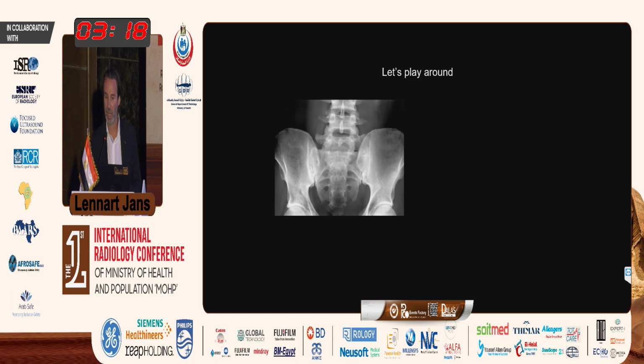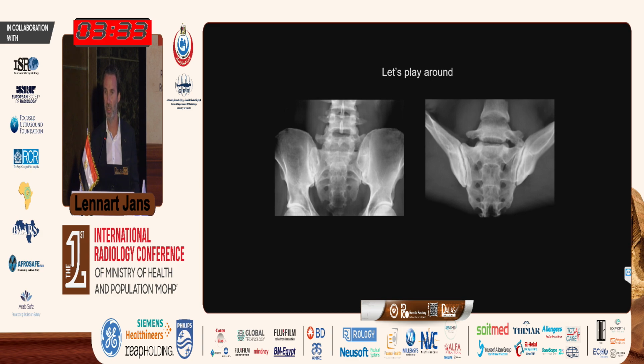And if you have a good look at the left side, you can see that there is a transitional anomaly. And our surgeons wanted to know, well, is there really an articulation or not? Well, we said, not a problem. This is 3D. We can just turn it around, and there it is. So this is an MR image showing the neo-articulation L5S1 very nicely.